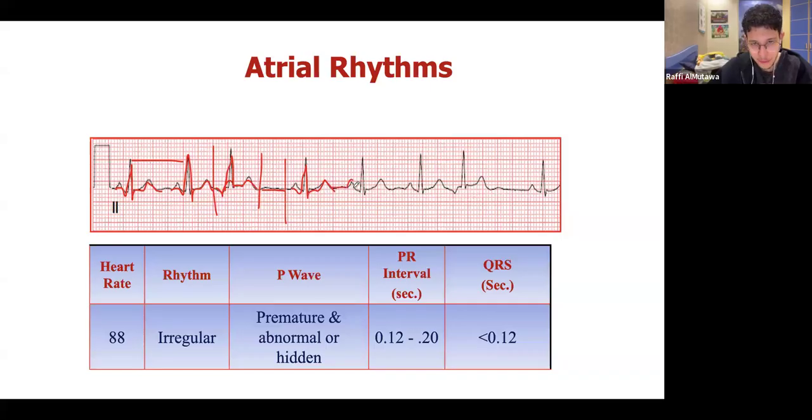The one that comes after it is normal. The one that comes after it, still normal, right? And then you get this abnormality. So as you guys see, it just happens randomly. This random abnormality means it's a premature contraction because besides these abnormalities, we have normal sinus rhythm. If the entire rhythm strip was irregular, then you're looking at a completely different issue, right? Whether it's AFib, SVT or whatever. But you're just getting these random premature contractions, this is still sinus rhythm. If you were to take these out, this would be sinus rhythm, right?